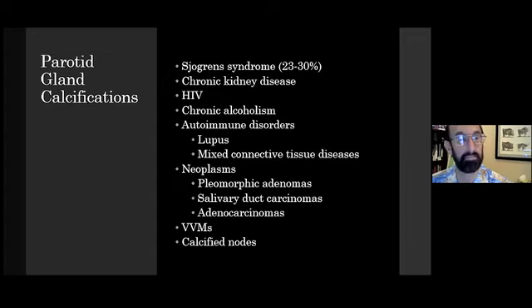With regard to the melanoma case, that also may be bright on T1, but the brightness on T1 is due to the melanin itself, or in those patients who have amelanotic melanoma, you can still have hemorrhage. Melanomas are hemorrhagic lesions, and therefore the bright signal intensity in a melanoma may either be from the melanin itself or from hemorrhage in a melanotic melanoma, or hemorrhage in one that is an amelanotic melanoma. And when we say amelanotic melanoma, we're talking about the degree to which there is melanin within the lesion. So that's usually bright on T1.